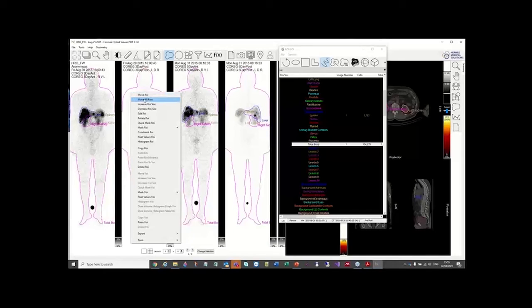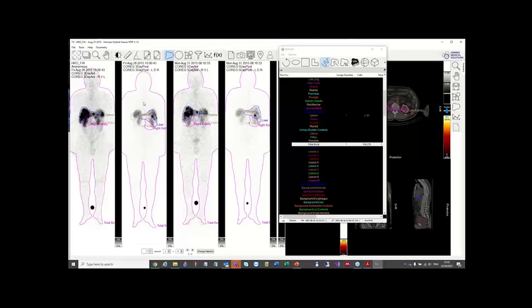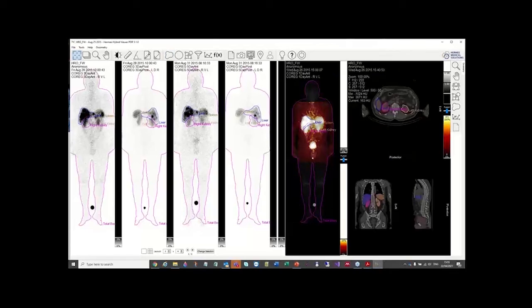So if the original lineup didn't work, you can move all the regions. The whole set now comes with me as I move my mouse. And then I can just drop it where I want. So in this way, hopefully the outlining of the regions, which tends to be the most tedious part of all of this, is made slightly less tedious. Okay. Going to go on to doing the calculation now.